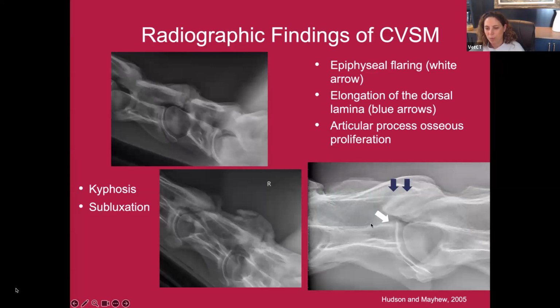So it's just one more finding that goes, okay, well, that fits, and we have articular process enlargement, and then I'm going to do my ratios. And if my ratios fit, then all those things together really help paint the picture for me. But I certainly would not hang my hat on that finding alone in any way, shape, or form. And if it were the only finding and there was nothing else abnormal, it wouldn't bother me. I probably wouldn't even think much of it at all.